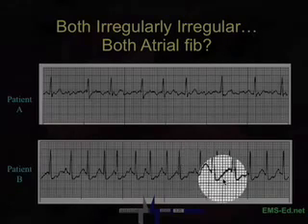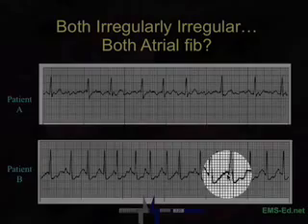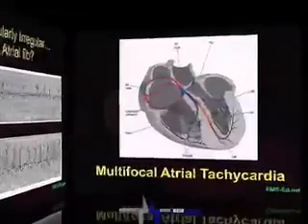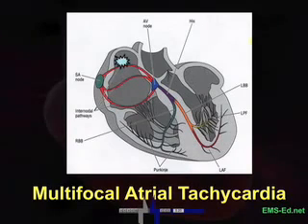Rounded, almost indiscernible. What is going on here? Well, this is what's going on. There's the pacemaker. There's the pacemaker. There's the pacemaker. The pacemaker is wandering all over the place.